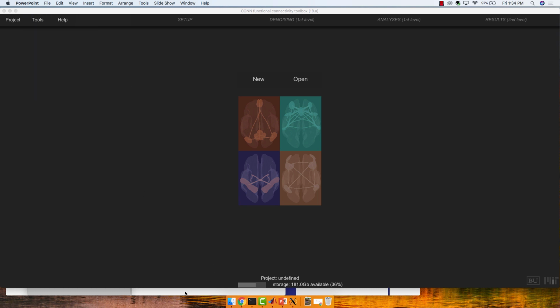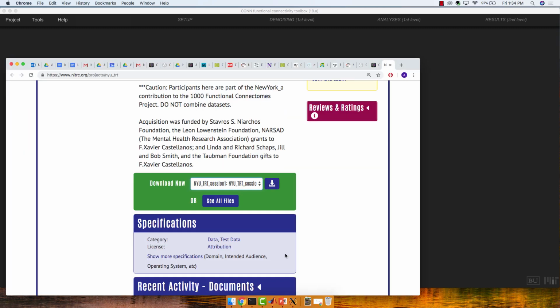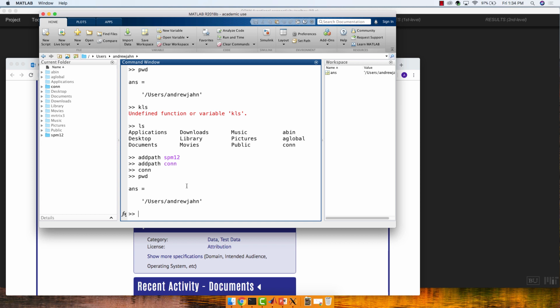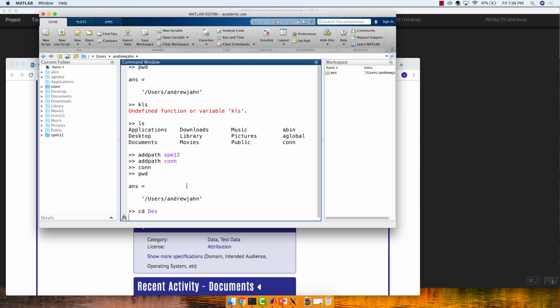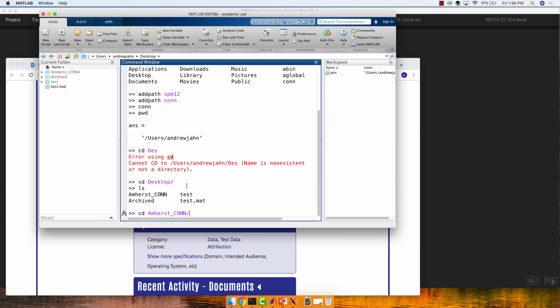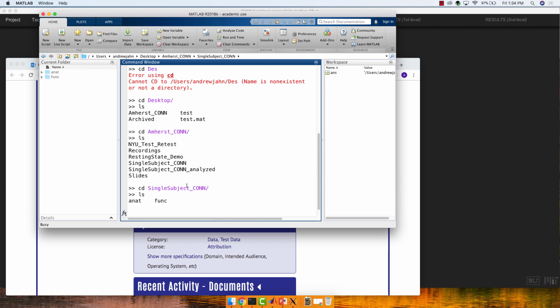Let's see here. So I'm going to go to my desktop, and I have this within single subject CONN.